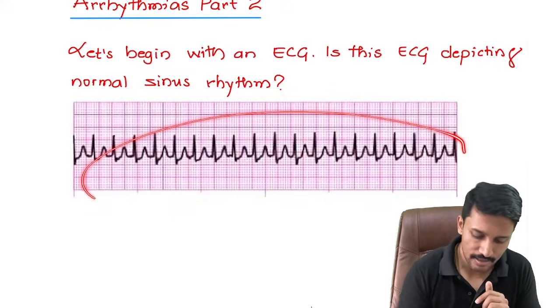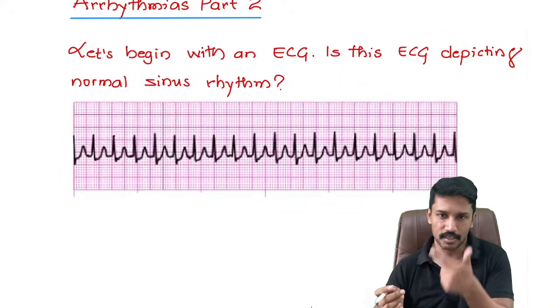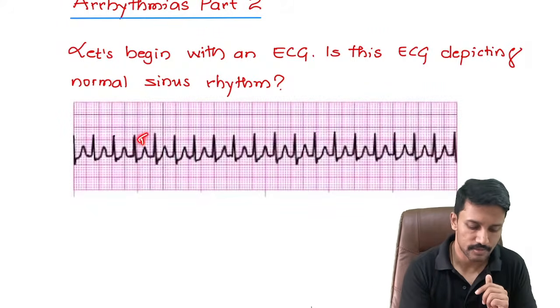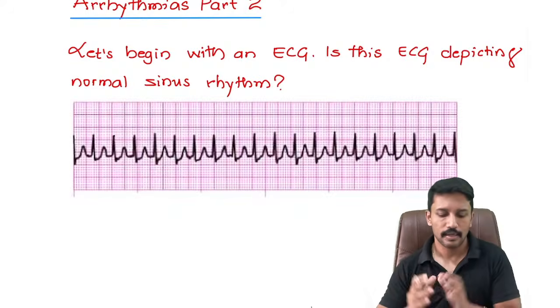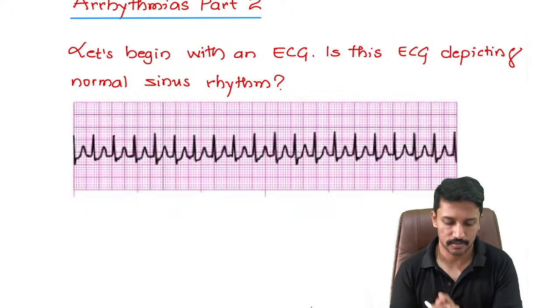And this we considered as not a sinus rhythm because, number one, the rate is not in the normal sinus rhythm range. Number two, we still have some speculation about whether these are T or whether these are P. So if I'm counting it as absent P, then of course it is not normal sinus rhythm. Okay, clear? Now these two ECGs have arrhythmias.